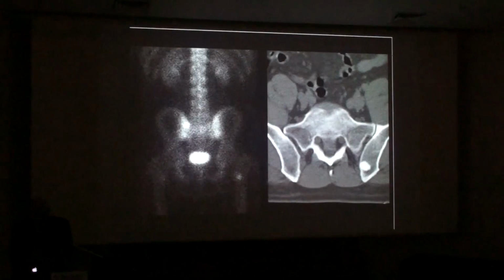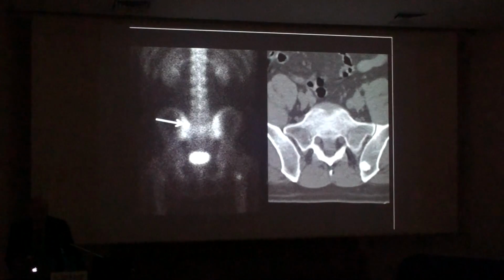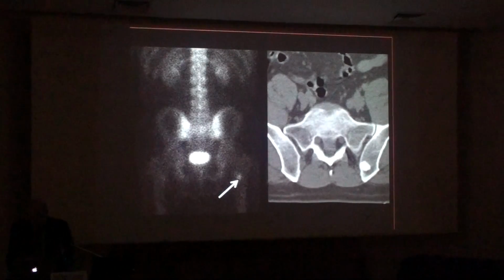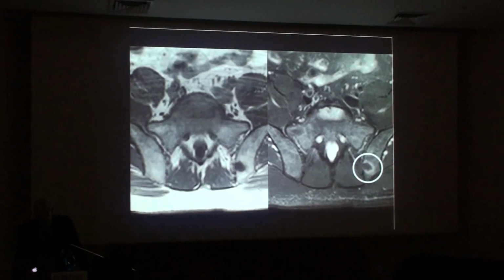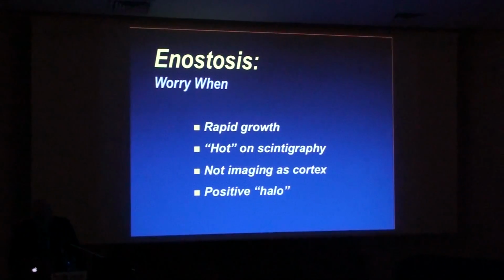Follow-up imaging with scintigraphy, which was normal 4 months before, now showed that lesion within his posterior ilium, as well as a second lesion within his lesser trochanter on the contralateral side. And of course, follow-up MR imaging beautifully shows that halo sign on the fluid-sensitive sequence, demonstrated to a better extent on the coronal STIR imaging with that nice halo of abnormal signal, which will show significant enhancement following the administration of contrast. So that can be very useful in distinguishing a bone island from a metastasis.